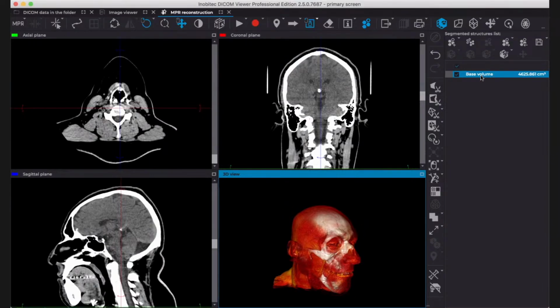in our DICOM image. So when we talk about segmentation, segmentation means labeling. So segmenting or labeling is, from this entire DICOM image and all these pixels, I want to select just some of them and label them, for example, as bone. So every pixel that is bone, I want to segment and create a 3D image from that. So this is what we're gonna do now.